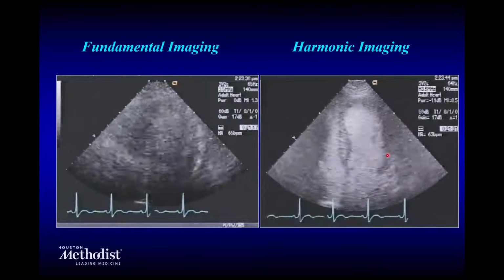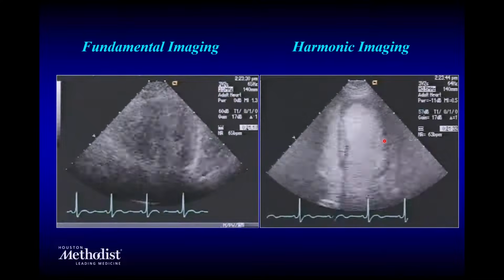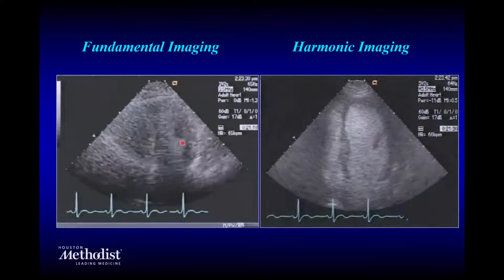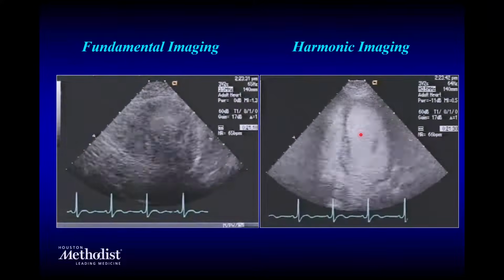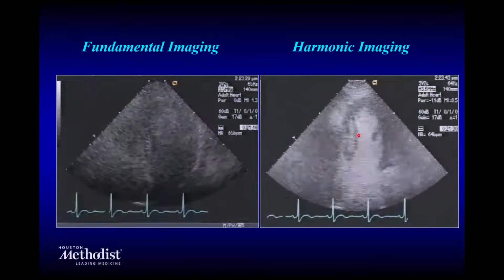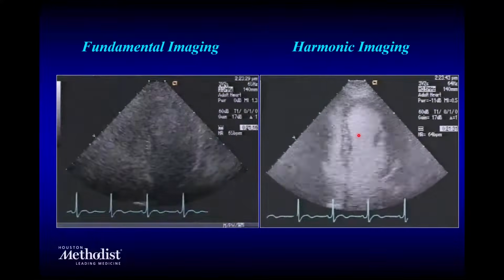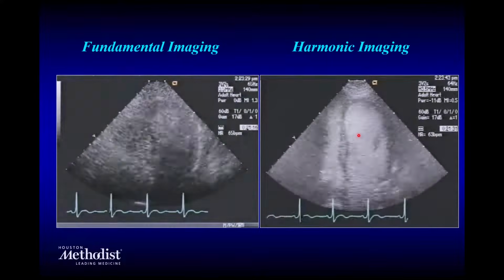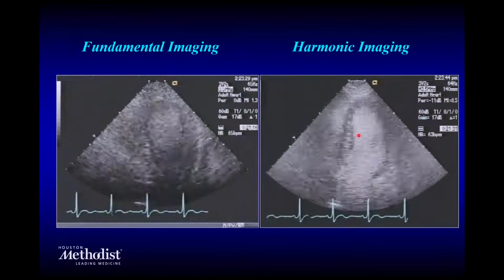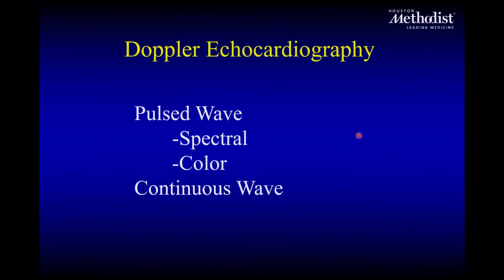I can see much better the delineation between the cavity itself and the border. And you could relay these two. This is almost simultaneous by just flipping fundamental imaging into harmonic imaging. So one of the lessons for you, and I think nowadays all the imaging equipment is equipped with settings for contrast imaging, which uses harmonic the vast majority of the time.